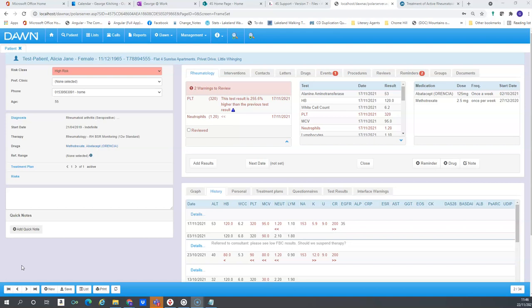Furthermore, there might be individuals whose full blood counts or liver function or UNEs are consistently different to the norm, and yet that is normal for them, not a sign of their medication, so you want to be alerted when their results are different to what the norm is for them. And in those cases, we can set up patient-specific test limits.